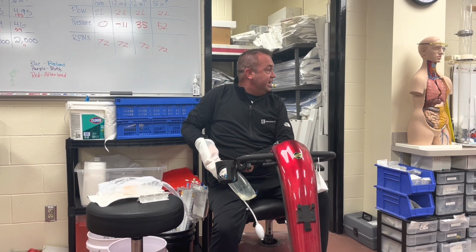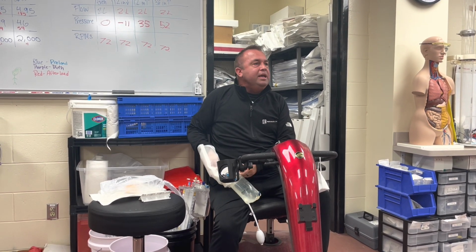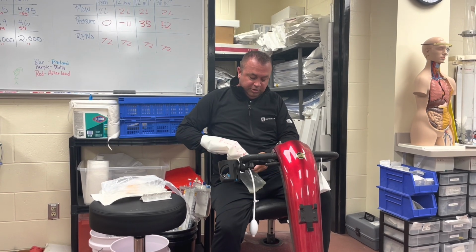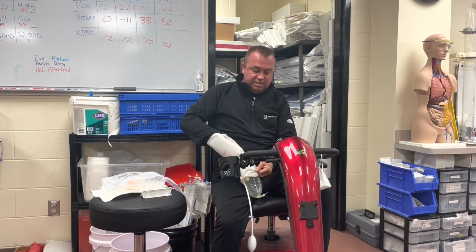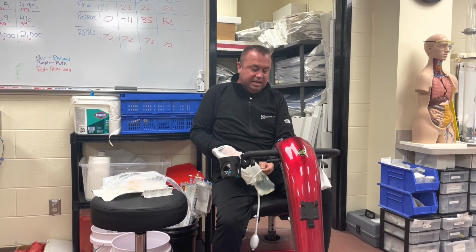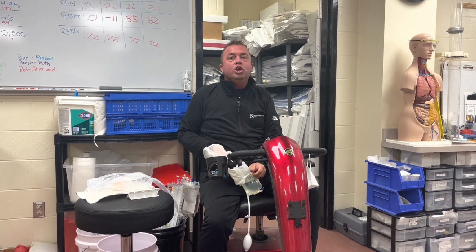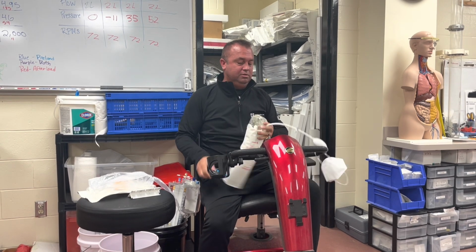If there is a hook in there, the hook is right here in the back, so hook the bag over that hook. Or another cute little deal with this pressure bag is when it just has this hanging tag on it, loop that hanging tag through our saline.